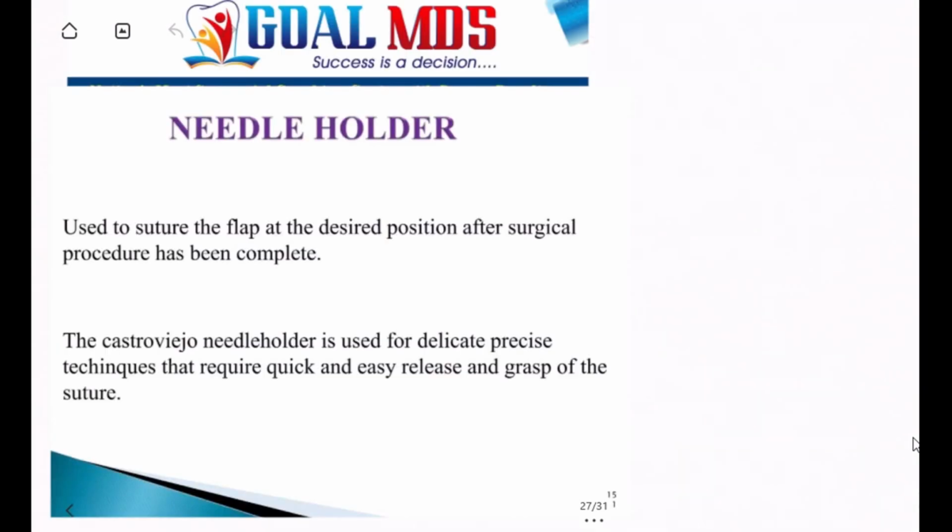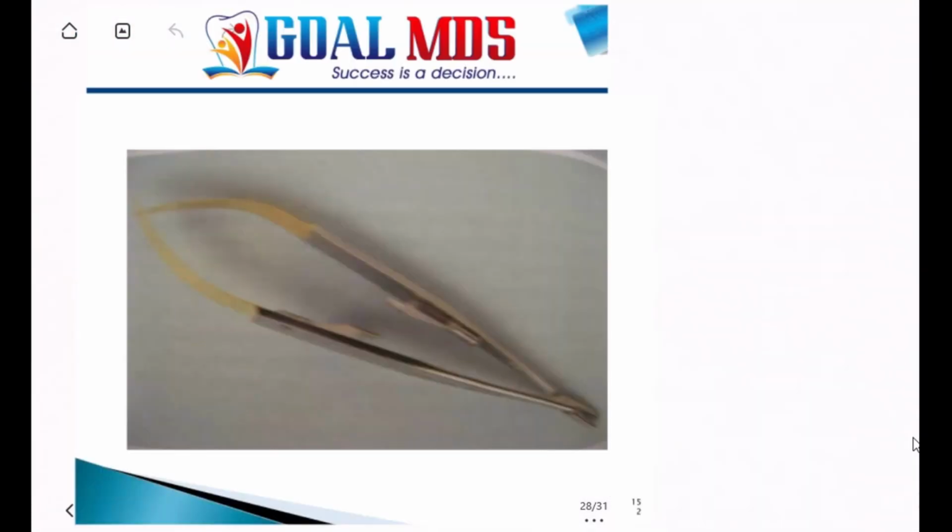Needle holder is used to suture the flap at the desired position after the surgical procedure has been completed. The example is Castroviejo needle holder. So this one is the needle holder.